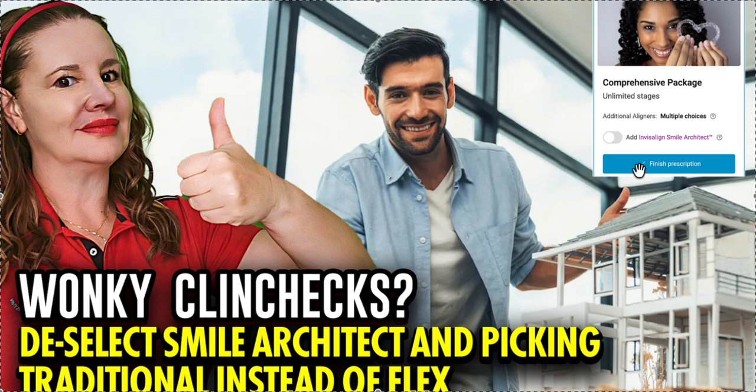Once the AI dictates where the final restored teeth should go, the human technician is tasked with moving the actual teeth to support the restorative goal. This is where things can get tricky, okay? So the reason your Clinchecks look bad is due to a tug of war between aesthetic ideas and biomechanical reality. Yeah, because I get a gag. I'm like, this is not possible. And that's my orthodontist brain. The AI doesn't inherently understand the biological limits of plastic aligners. It will try to do it, but it may not be possible. So it may look beautiful in the plan, but it may not be possible to do this. Yeah, I've been saying that.